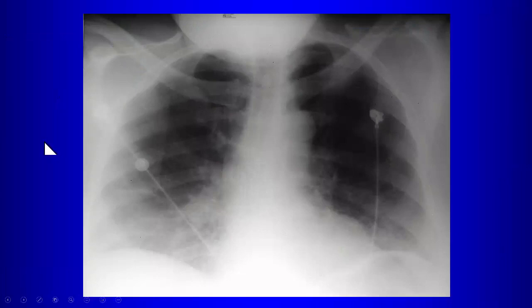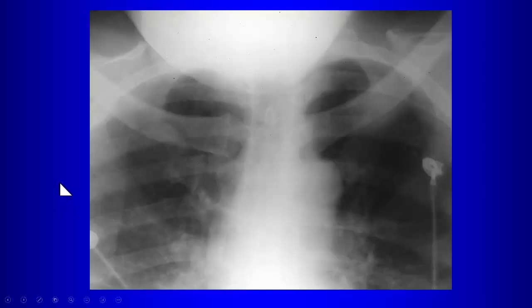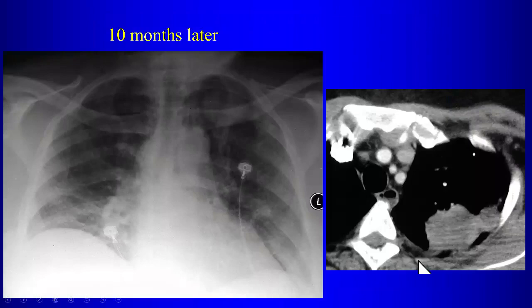Here, no? Right upper lobe medially? So you think it's right upper lobe medially? How about it? Oh, let's be fair. Let's look at the close-up. Yeah, so there's a little bit of increased opacity there in the left upper lobe. There's a tumor there. Okay. Now, this one was not picked up prospectively, but just to show you how subtle this can be.